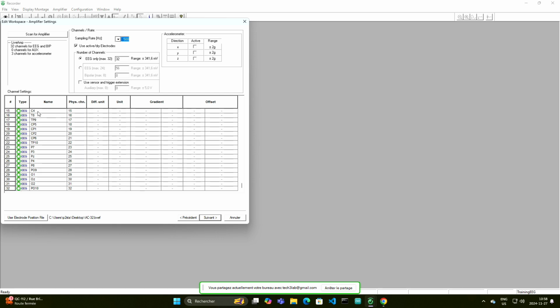Now I can see right away that this is correct, and not having the names in this position will cause a lot of headaches later. It'll leave a lot of questions on what exactly was the anatomical position, first of all, and second of all, it'll make it difficult for you to do any intelligible analysis on your data because you won't actually know what the anatomical positions are in any of your visualizations.